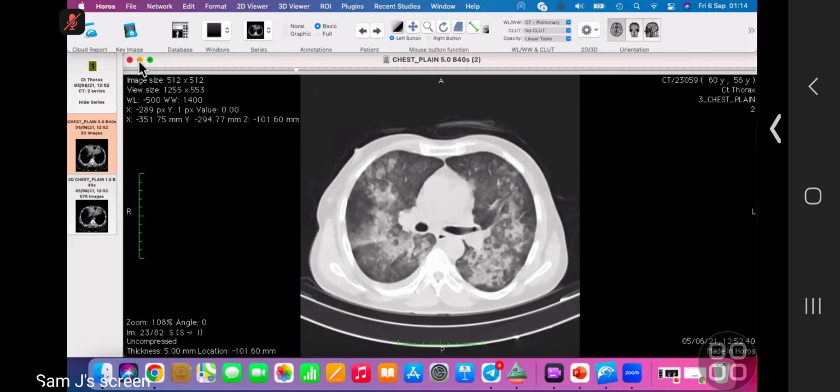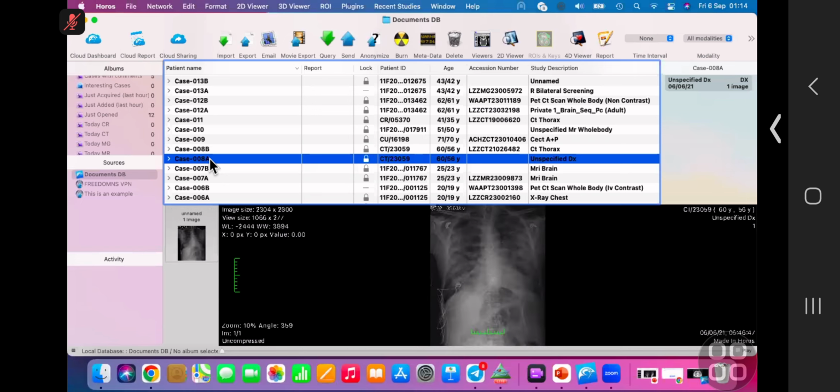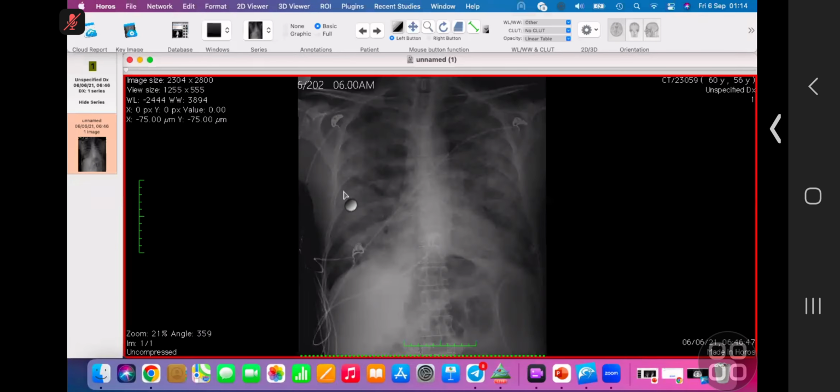Okay, fine. Let me take over. I'll explain the radiograph first. You explained very well. These are nothing but fluffy airspace opacities, and there is no set pattern. It is just diffuse and predominantly at the perihilar region, and I'm not seeing any pleural effusion though. The CP angles are clear, but the right heart border is quite hazy and not very well defined.